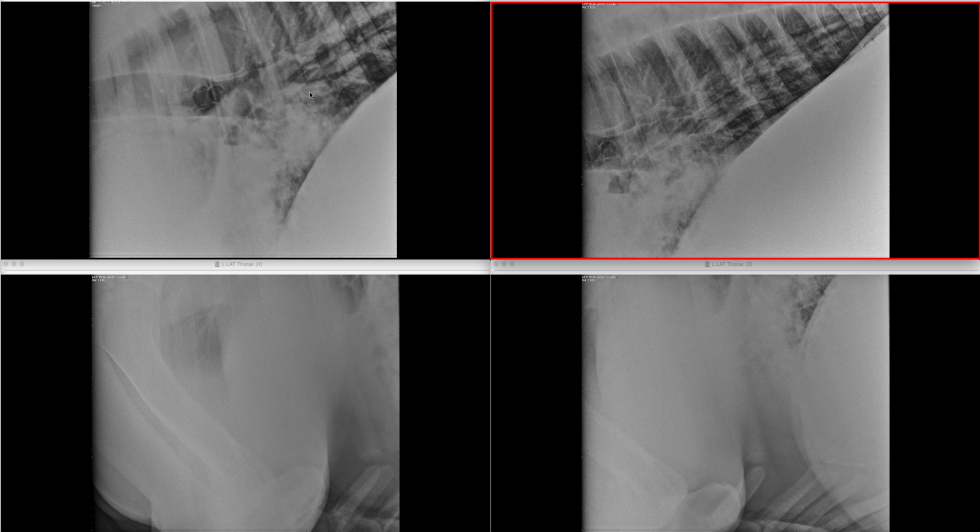If we think about what could cause that, that's a fairly classic appearance for a pneumonia or bronchopneumonia in a horse. It's a fairly classic location. The cavitatory lesions here would then most likely be abscessation, and we can make quite a nice story that this horse has a bronchopneumonia, which is what's causing her to cough, and we can also speculate about what our possible etiologies of that are.